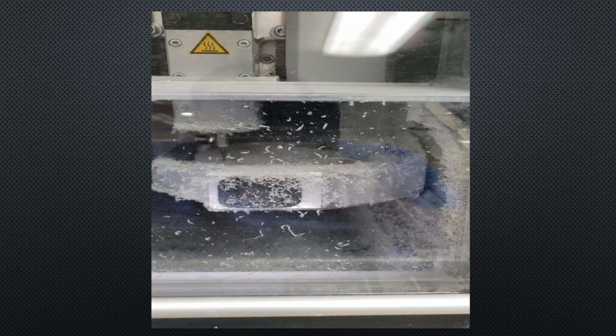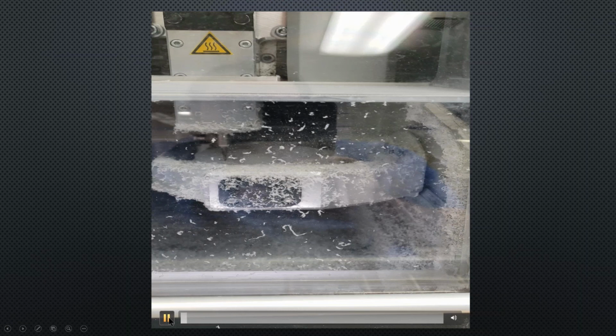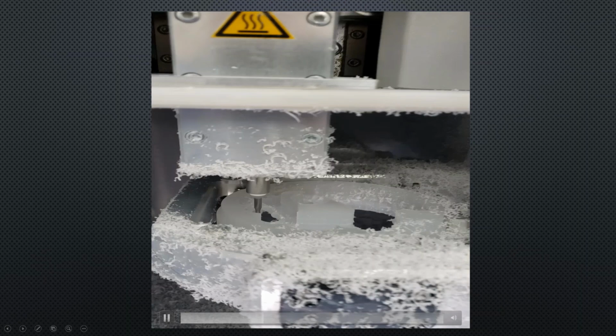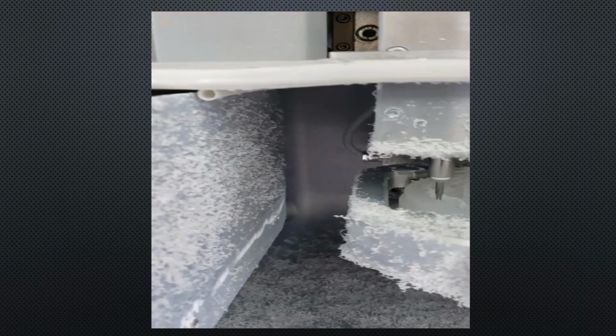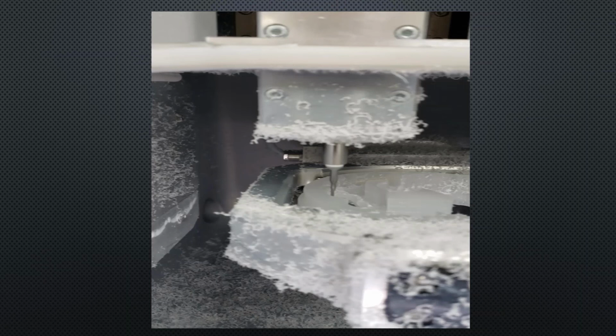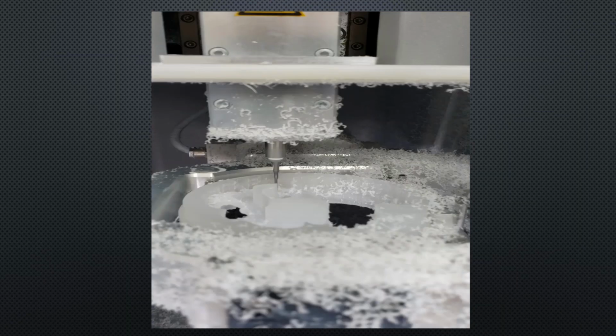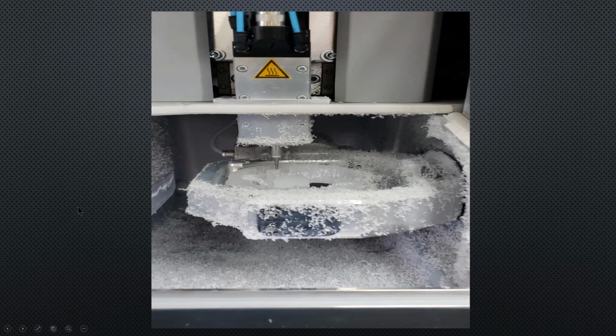I mean, it's not a little bit. I've probably run a good 60 or 70 cases through probably about 30 different pucks, and I've had zero issues with that. So if you watch, I'm going to go in here, and you can see the chunks everywhere. Okay. And so just be careful with that.